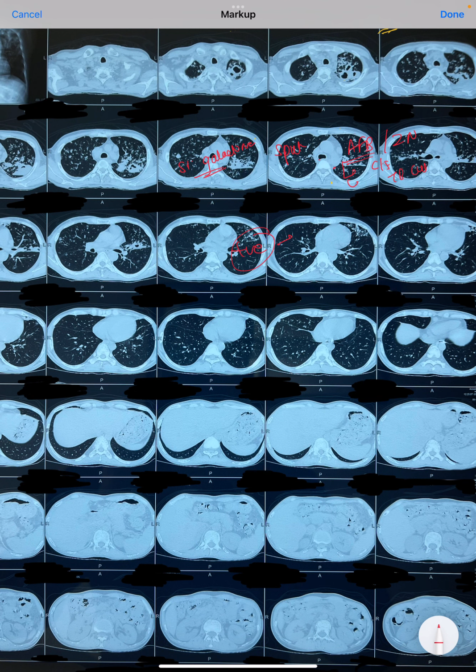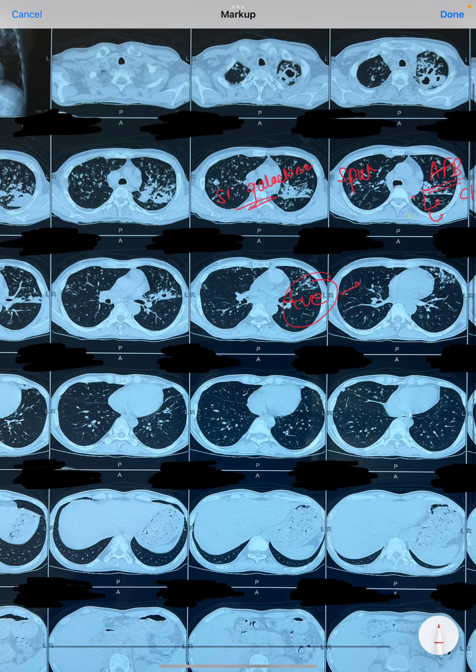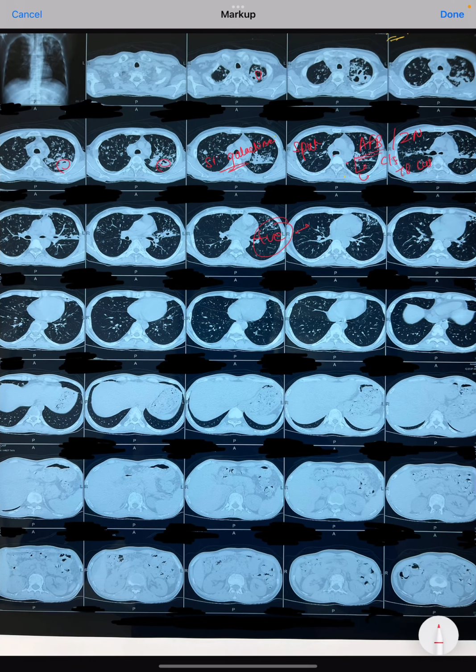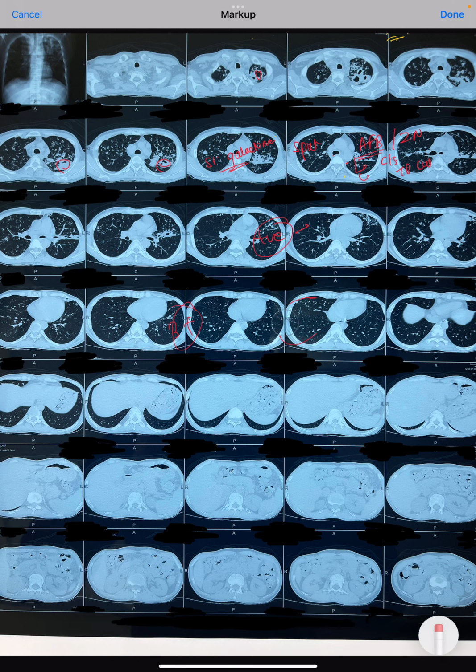If the patient is not responding to antibiotics, and in very specific cases, we can send for fungal culture and sensitivity. So this is a very interesting CT scan showing multiple fibrocavitary lesions. There is no fungal ball in it, and it is showing an active pneumonia patch, which should definitely have good AFB bacterial presence in the sputum. This patient had 3 plus tubercular bacilli in his sputum.